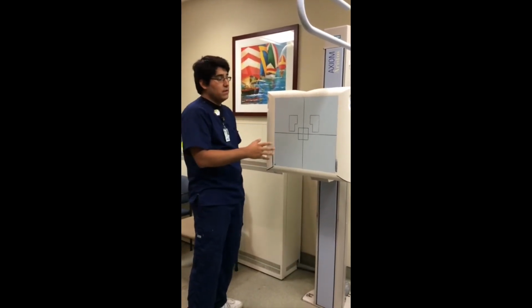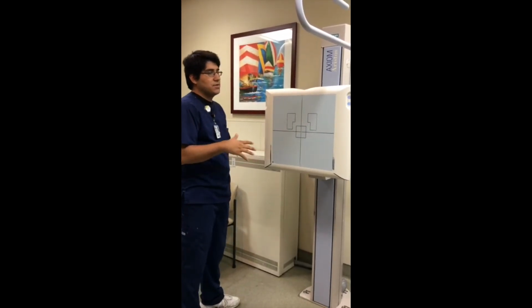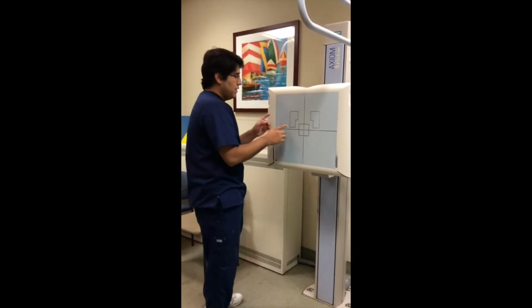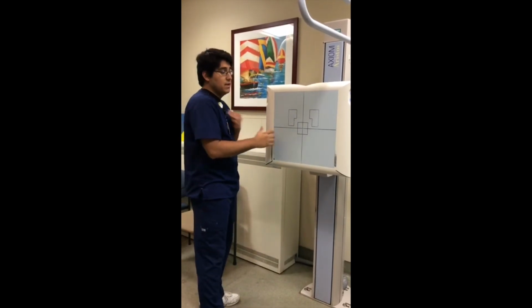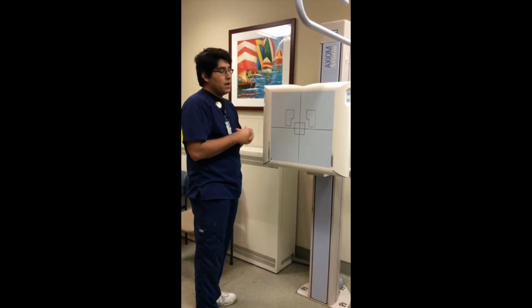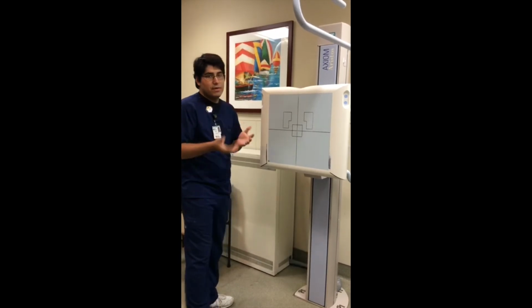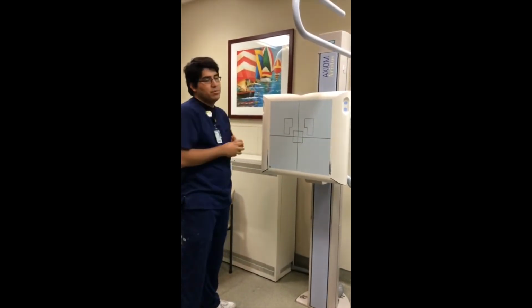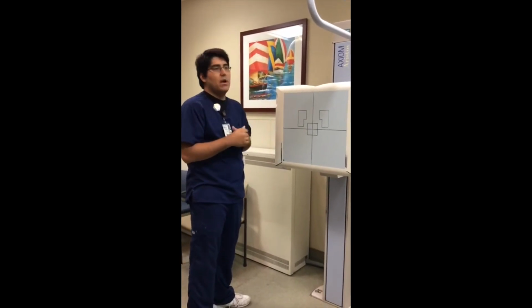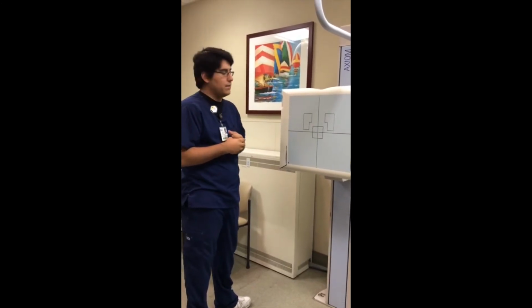So that's why it's very important to know what detectors to choose. Now the great thing is that a lot of it now is just on the computer. Obviously I can't show you guys on the computer here, but basically you would have either some type of buttons that you can press on a console, on a type of panel, or you can also do it on the computer where there's a button that you can select and you can choose what chambers. Now obviously for every study that you do, the chambers are pre-selected already for you for what it should be. So you shouldn't really be playing around with that too much because they're already pre-programmed for the studies.